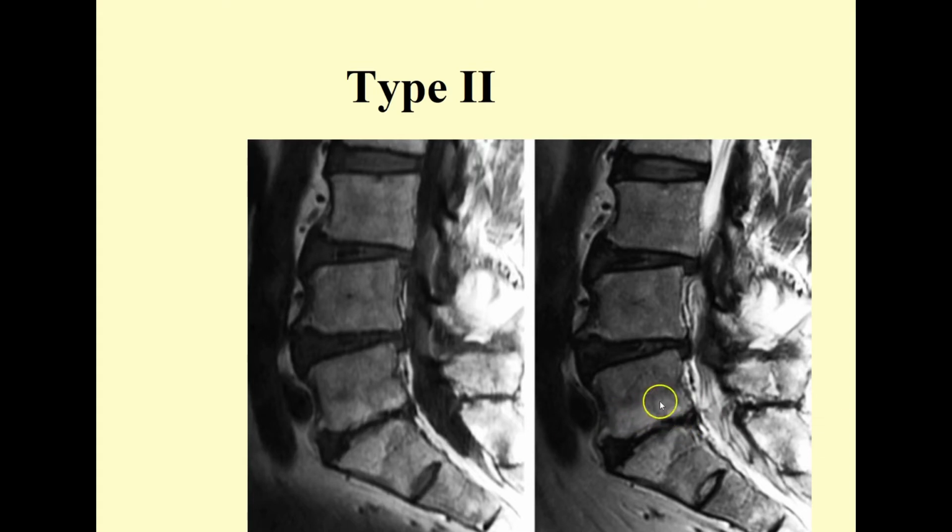So I would look at this patient and say, this is an early type 2. They've begun the fatty degeneration process, which is why we have these hyperintense zones on the T1 weighted image, but they also have remaining some of the edema, a carryover from the first phase, if you will. Now, if we were to come back some years from now, my prediction would be that we would see a more easily identifiable up signal or hyperintense signal on the T1 weighted images, and now it would be isointense on the T2 weighted images as the fatty marrow conversion has completely displaced the edema signature.